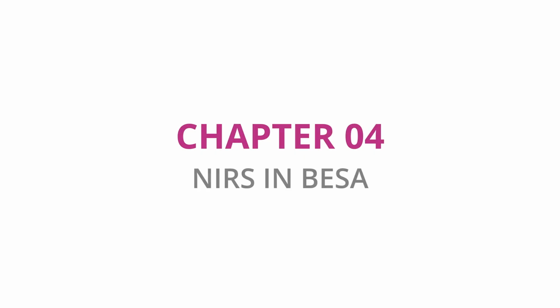In a not so perfect world, remember that even the sample rate of the NIRS is not exactly 13 Hertz. Could be 13 this time, could be 12 that time. It could shift and jitter a little bit. So give and take, what we want to achieve is that every 1 second we send a trigger to the actual NIRS file.